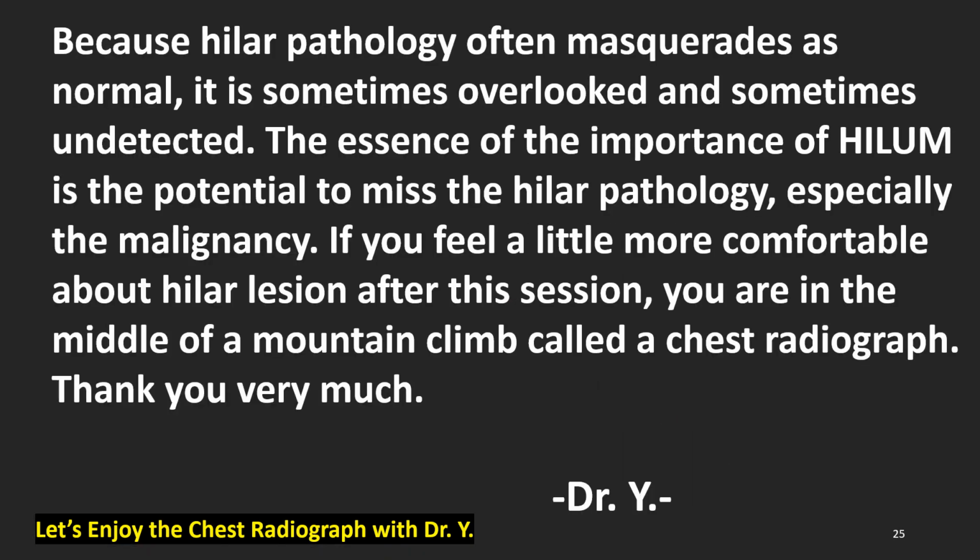Because hilar pathology often masquerades as normal, it is sometimes overlooked and sometimes undetected. The essence of the importance of the hilum is the potential to miss hilar pathology, especially malignancy. If you feel a little more comfortable about hilar lesions after this session, you are in the middle of a mountain climb called the chest radiograph.